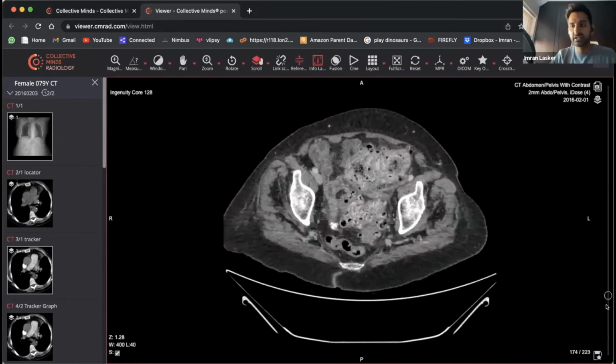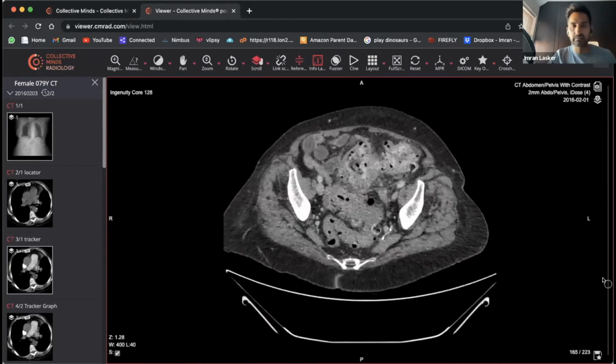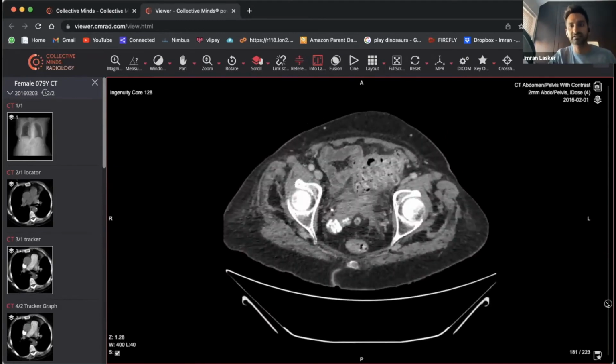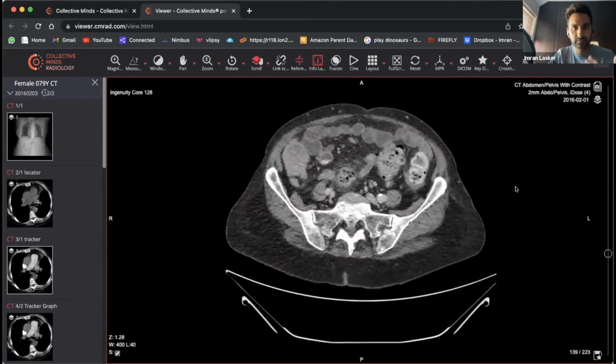So it's quite a useful diagnosis to be aware of when it doesn't quite conform to, I'd say, ischemia, diverticulitis, appendicitis, epiploic appendicitis. When you really think about it, this particular image doesn't conform to any of those things. But there is definitely something wrong, and that's what it is. It's called Stercoral Colitis.